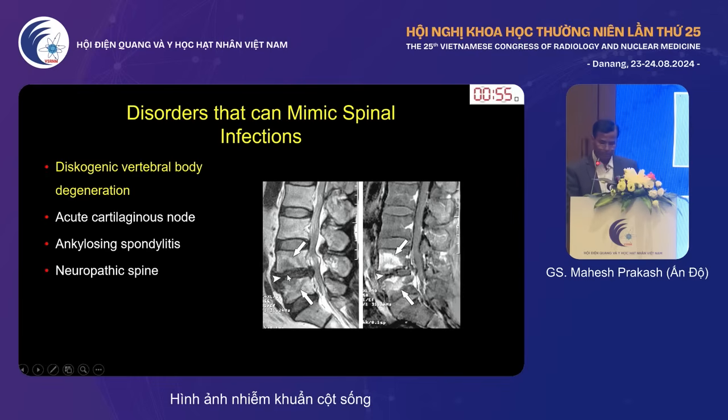Usually in the case of disc disease, you can see edema in the vertebrae or end plate, but usually the disc is hypointense. So it's desiccated. Not much fluid is there in the disc, so the infection is not there. Probably in these cases, you are dealing with degenerative disc disease, not infection.